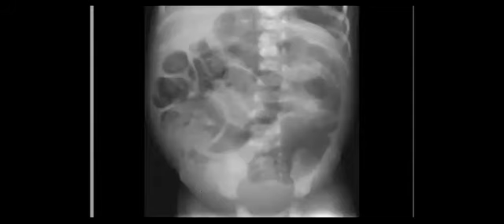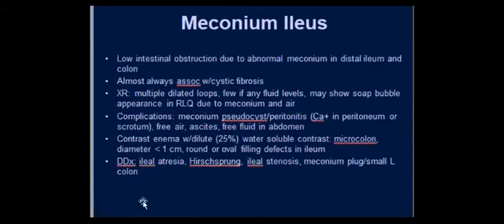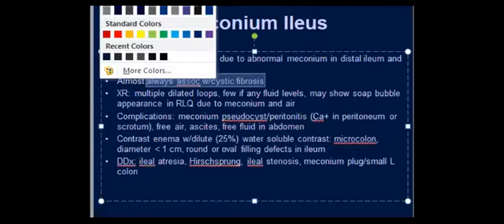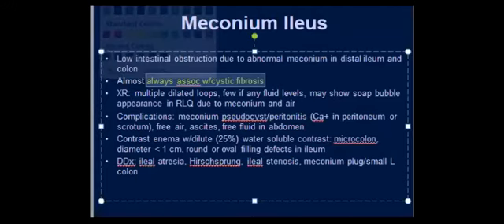Long microcolon, the differential diagnosis is either meconium ileus or distal ileal atresia. And we mentioned that meconium ileus, which is a long microcolon, will have the cystic fibrosis patient type and some filling defects. And finally, the contrast can reach the ileal loops. So this is what is called meconium ileus, almost always associated with cystic fibrosis, as you mentioned.